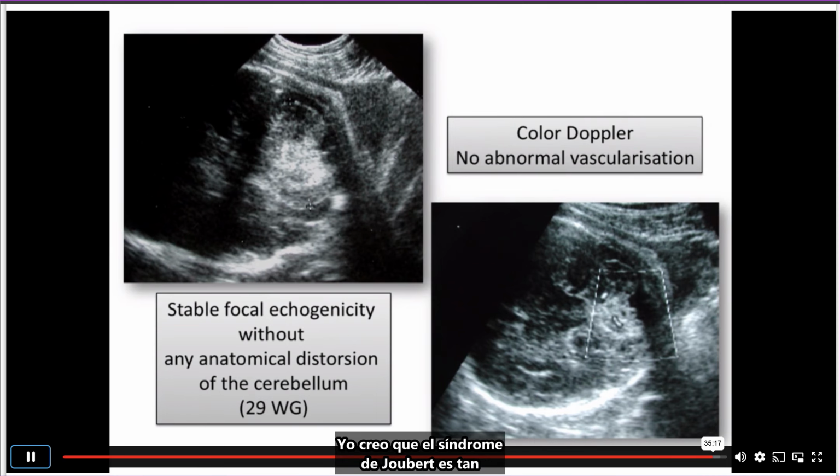I think the most important sign is that you may have some modification of the fastigium and you have also agenesis of the vermis. But to diagnose this entity, you have to focus on the elongation of the peduncles and the modification of the shape of the fourth ventricle. In routine, for experts, looking at the fastigium can be useful, but for sure, you can have modification of the fastigium without modification of the fourth ventricle. In that case, it's not Joubert syndrome.